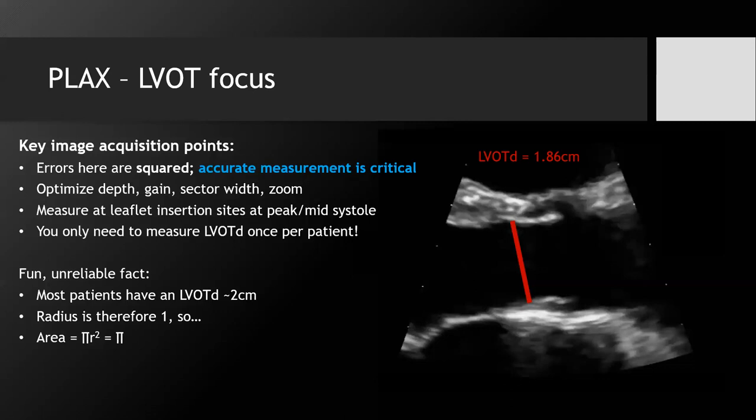So it's something to be very, very cautious about, but sometimes people do. Best thing to do is obviously get your LVOT diameter once, then use your VTI throughout the hospital course. If you can't, be very, very cautious in using the VTI. What you can do with the VTI is still trend that over time. But to assess your actual quantity of cardiac output day to day, you can't, or at least your initial cardiac output. So if you want to see a % change in cardiac output, you'll still be able to use your VTI without parasternal long axis views.